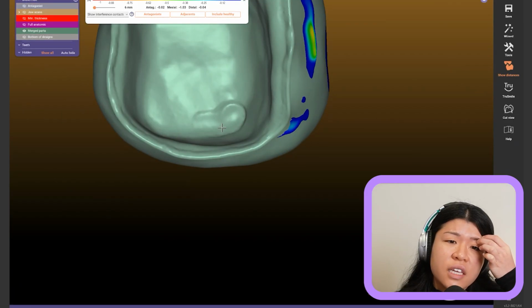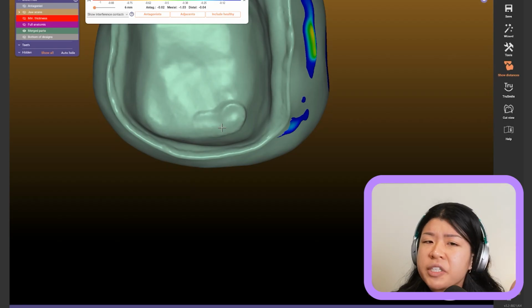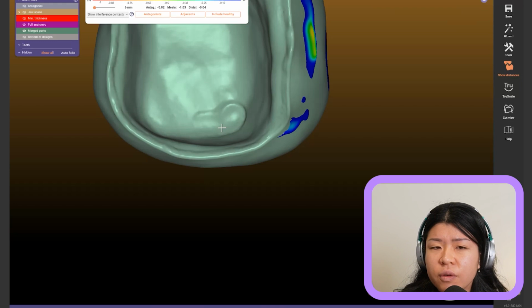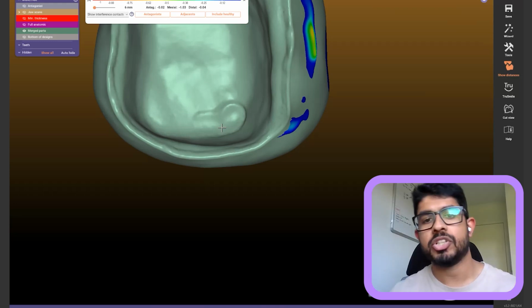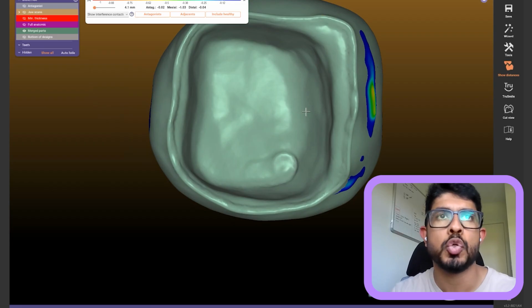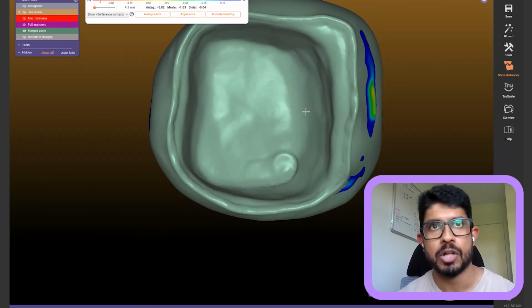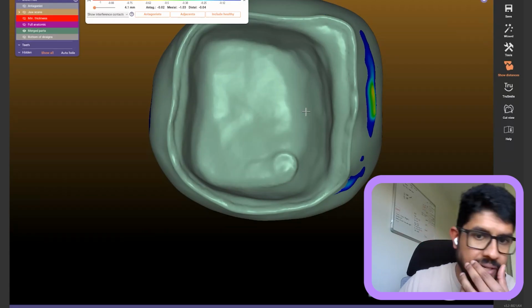Is this only for if you are using a CEREC, or what happens if you're using a different mill? Why don't you necessarily need this step if you were using something else? It depends on the thickness of the burr that you're using. For CEREC, you've got the two motor mills, which are the previous MCXs, and then you have the MCXLs, which are the four motor mills, the four-axis mills, and then you've also got the PrimeMill, which is another four-axis mill.